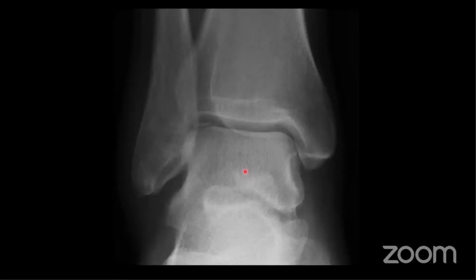Right, okay. What about this one? Yep, very good.